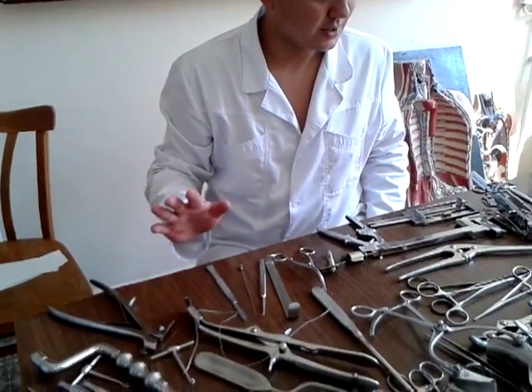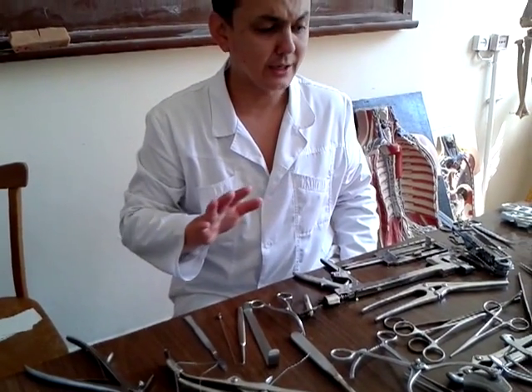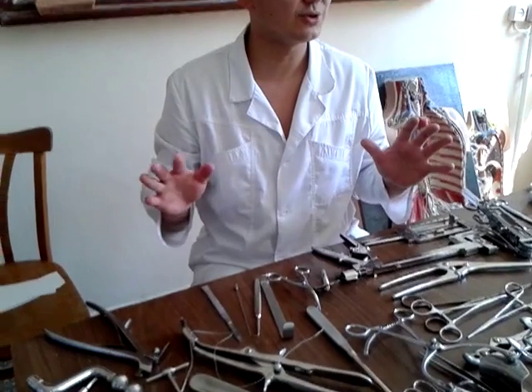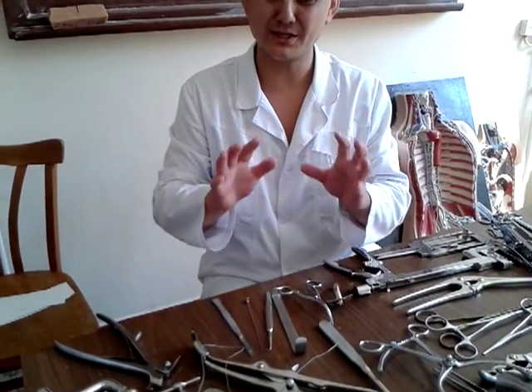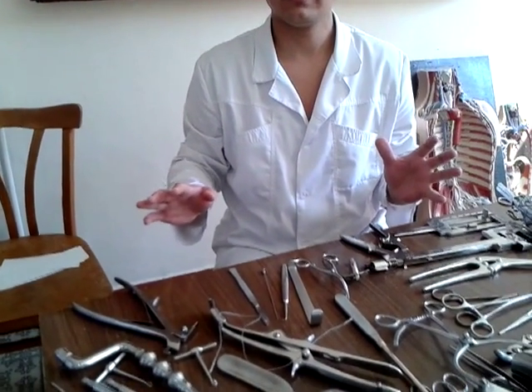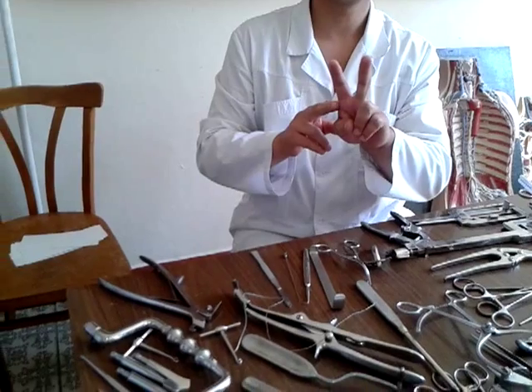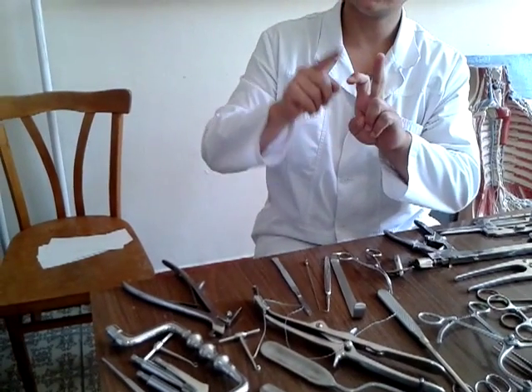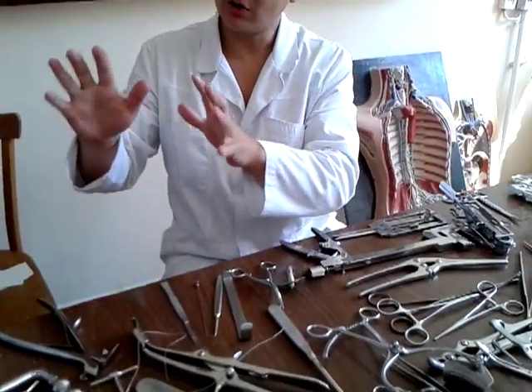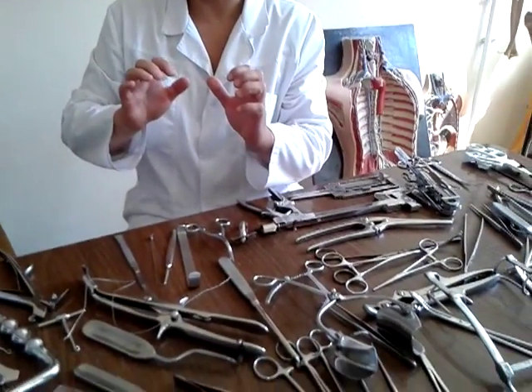For the common group, and now the questions. Some questions you must choose the special instruments for different operations. One of them, trepanation of the skull. There are two types of trepanation, osteoplastic and decompressive. That is why we also have two questions in the practical part.